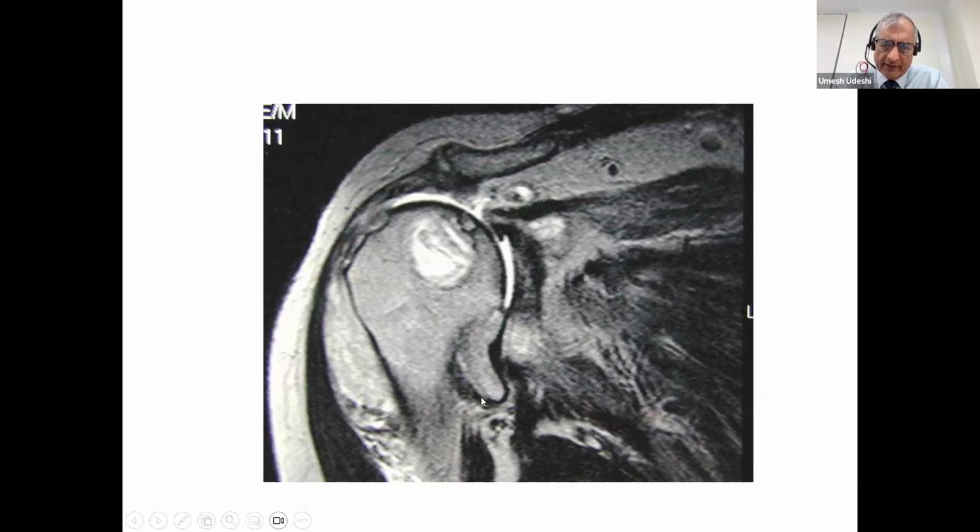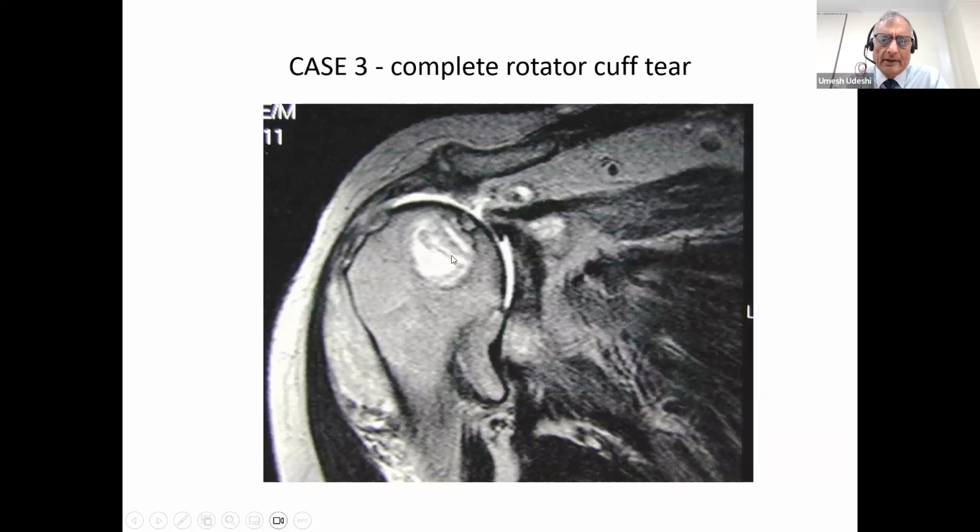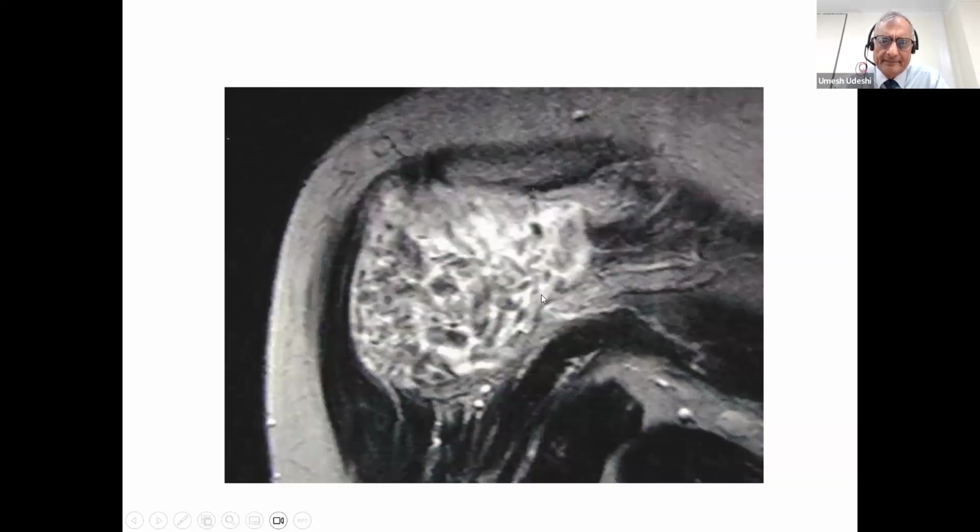There's a huge osteophyte underneath the humeral head, arising from the humeral head. There's something very abnormal out here, gray stuff, which is probably synovitis. There's a degenerate acromioclavicular joint. There's osteophytes underneath and above. So it's all looking pretty abnormal. And there's this little high signal hole, if you like, in the humeral head. That's probably an erosion or a cyst. So complete rotator cuff tear.